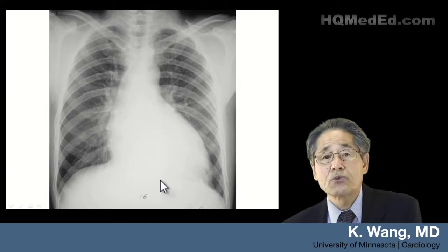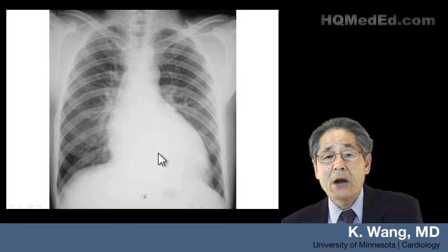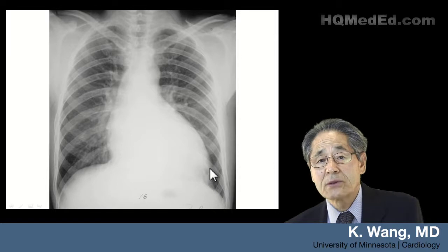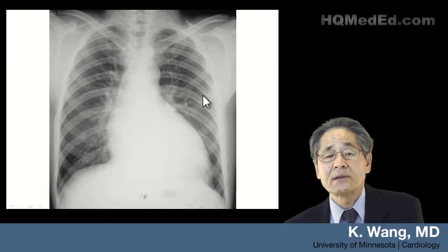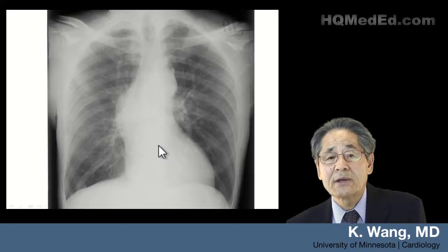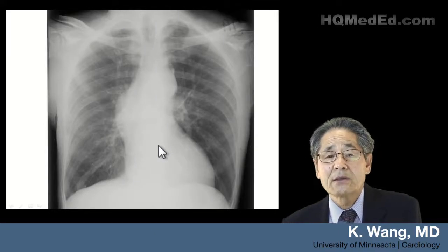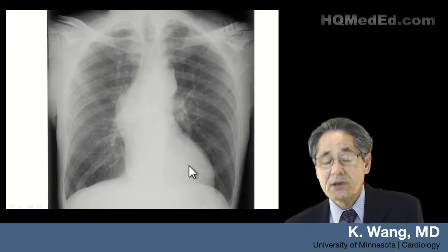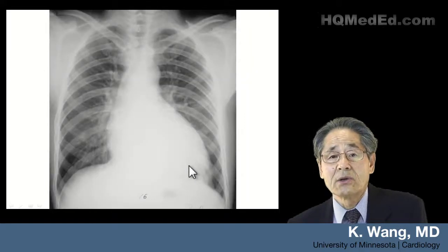While in aortic regurgitation, it's a volume overload lesion, so the left ventricle will be displaced downward and to the left. So you can appreciate by the shape of the cardiac silhouette, this is massive aortic regurgitation, while this could be tight aortic valvular stenosis, and the heart may weigh 2-3 times normal, but if it is not dilated, you will not have an enlarged cardiac silhouette, not like this one.